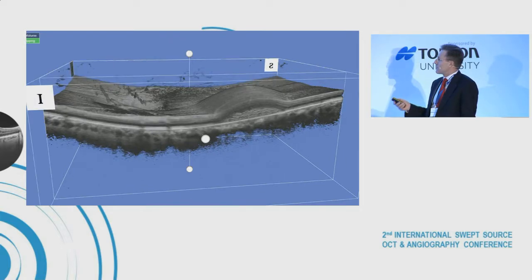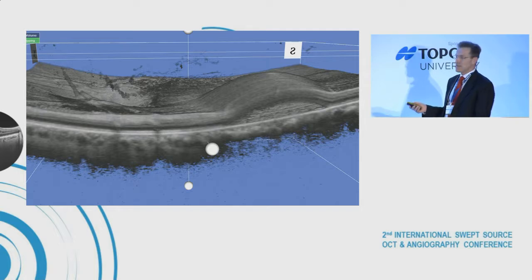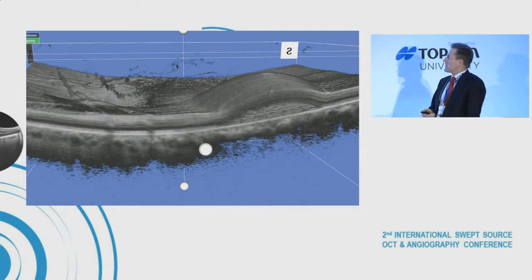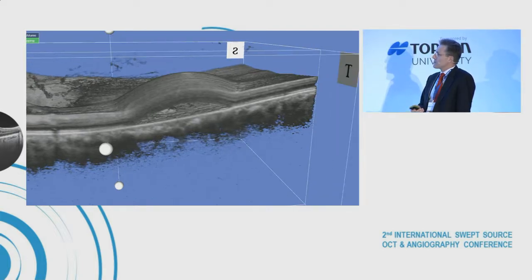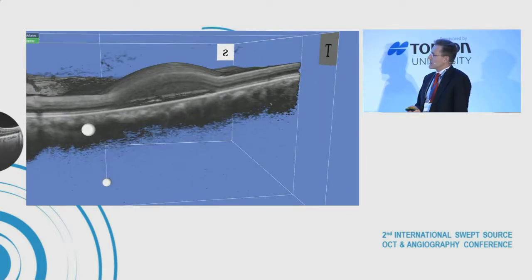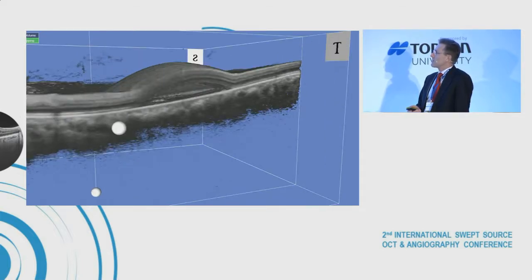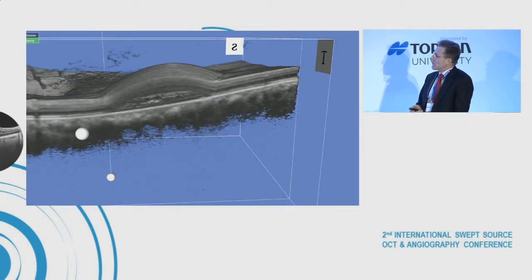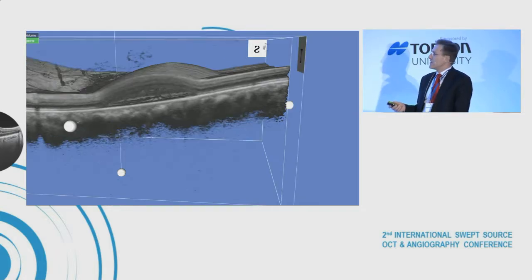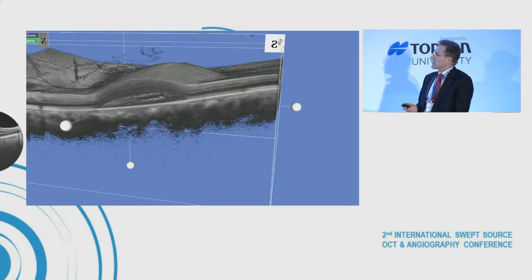Actually, it's from the feet, I believe. We can move in, look at the bottom of this cavity, and see that it's cobbled because of all the debris from the photoreceptors. We can shift it, and we can twist and turn it so that we see the floor or the roof as we have it here. We can look for the strand of fibrin that extends from the pigment epithelium detachment to the peak of the dome. It's right here in the middle of the cavity.